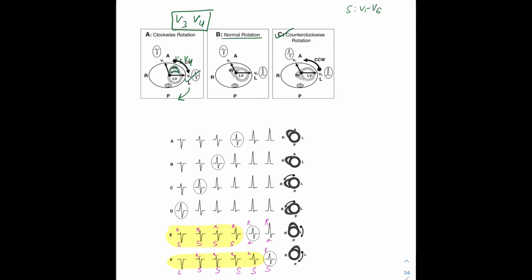Similarly, coming on to the right side of this figure, you will see when we have left ventricular hypertrophy, the left ventricle becomes more anterior and there is shift of the transition zone again from V3, V4 to V1 or V2. Since we are looking at this figure from below the diaphragm, the direction of the shift is counterclockwise, therefore it is also called counterclockwise rotation. So this is how there is shift of the transition zone in case of RVH and LVH.